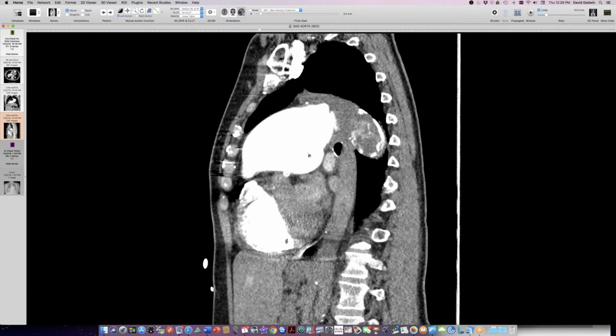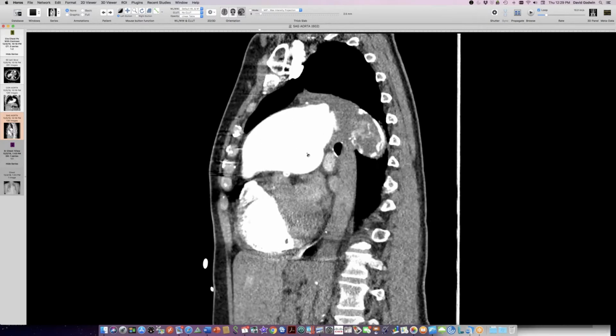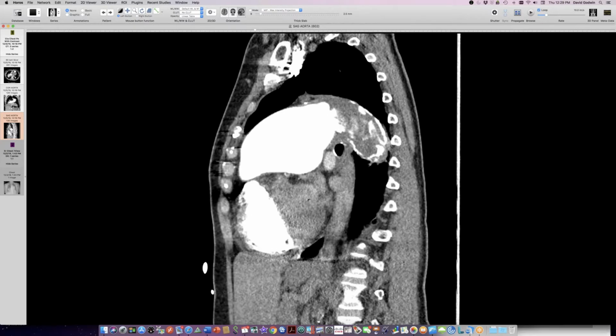So Seth, have you seen any pulmonary artery encroaching on coronary arteries like this? Yeah, I showed a case about 4 years ago that was the exact same issue. Massive PH, remember that? So yeah, okay. And then what's interesting is I really wonder if she actually had CTEPH.